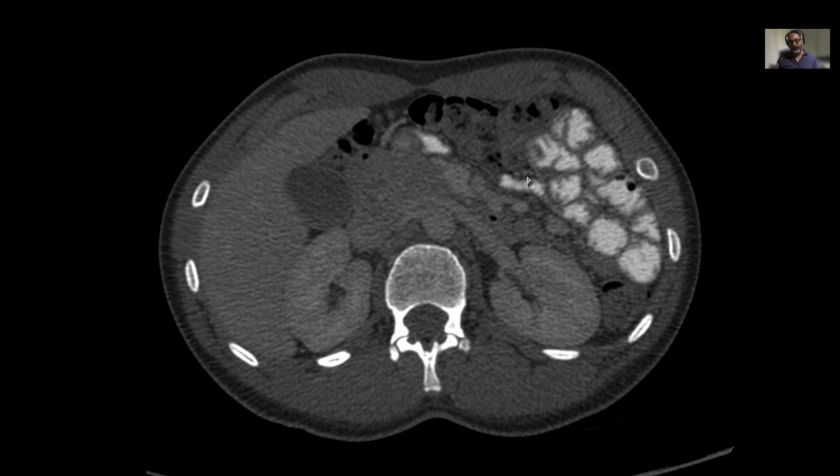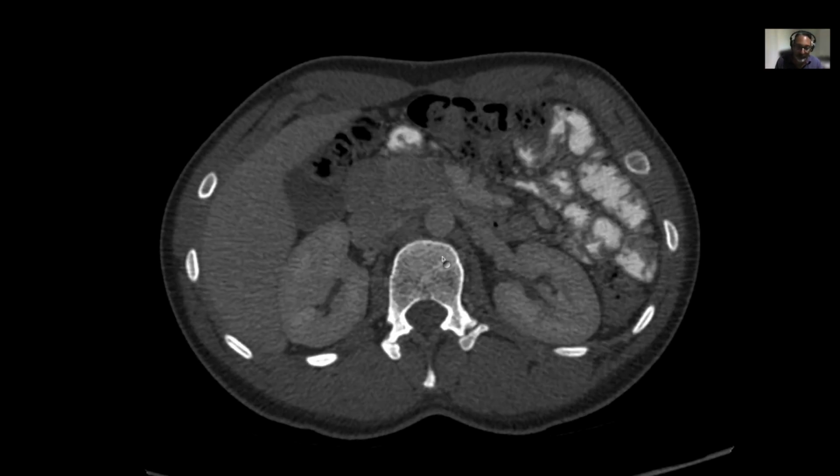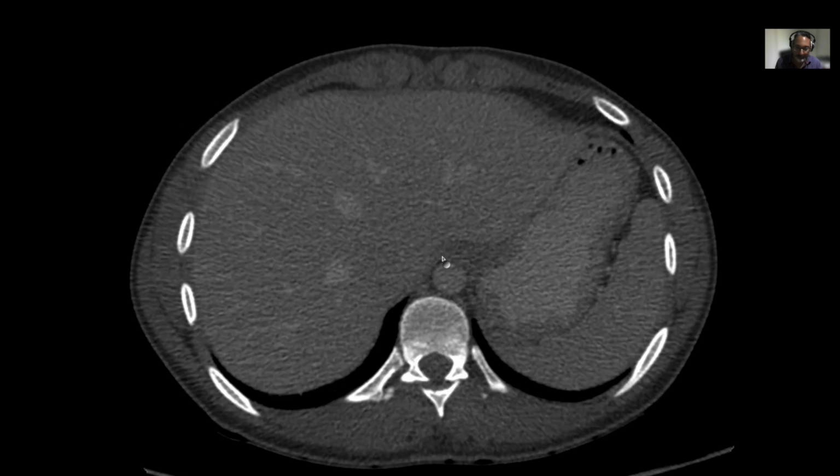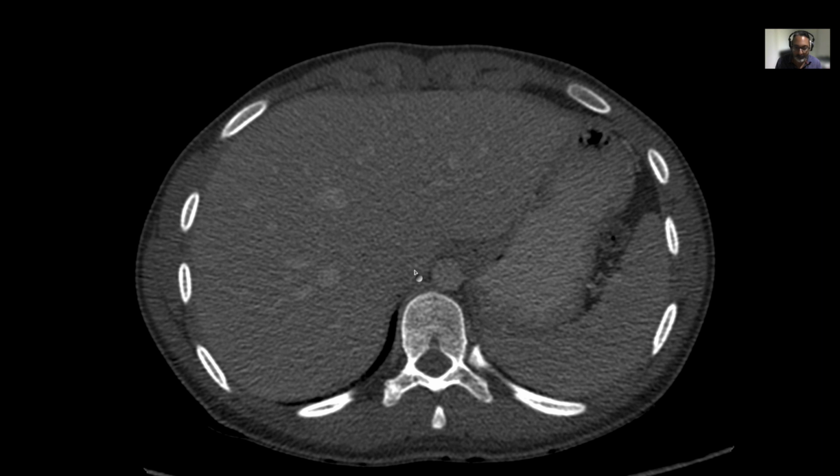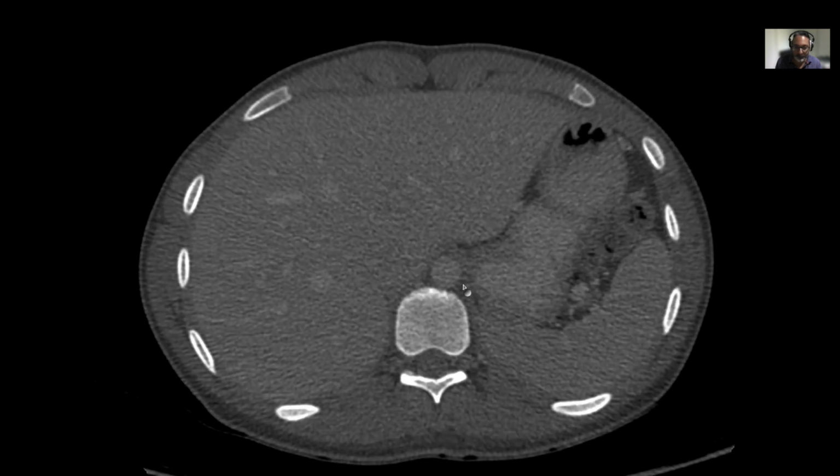So it's intraperitoneal and retroperitoneal. Once you've got that in mind, then you just follow the vasculature. And the lymphatics are around the vasculature, and around the vasculature they sort of come together, and they're named around the vessels. So let's just do the extraperitoneal ones first. So extraperitoneal ones, if you start right up at the diaphragm. So this is the aorta, the IVC is right here. So there are para-aortic lymph nodes, which you sort of even can see here.